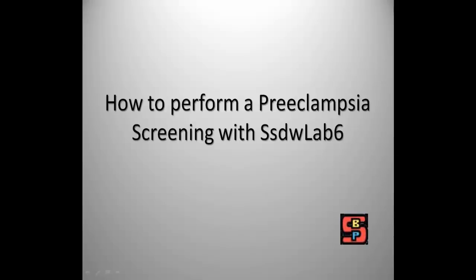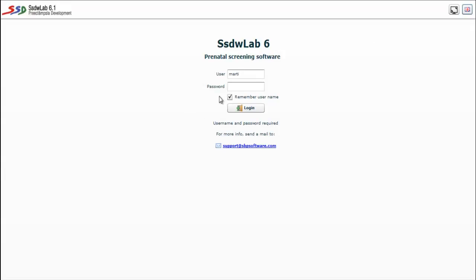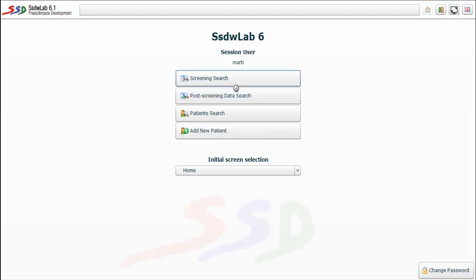Now we will see how to perform a screening of preeclampsia with SsdwLab 6 as usual. First of all, we enter the web program with our username and password. Once inside the program, several options are presented, and we choose the option Add New Patient.